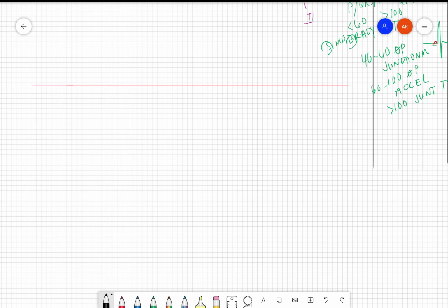Okay, so I have a QRS here, QRS here, QRS here, QRS here, for the most part. I've got a P wave, P wave, P wave, P wave. And then I have a T wave. Let's just connect that together. Okay, that looks really sloppy. It is what it is. So if my markings all line up, you know what? I really hate this. We're going to start this over. This is really awful. I'm just going to free draw it, and I hope you get the point.